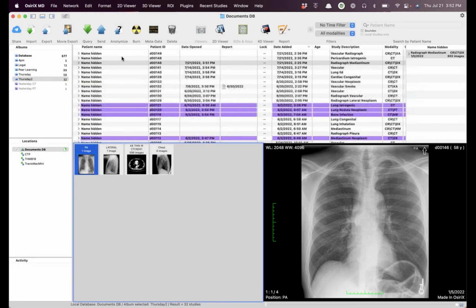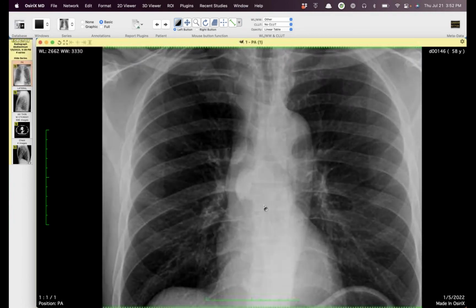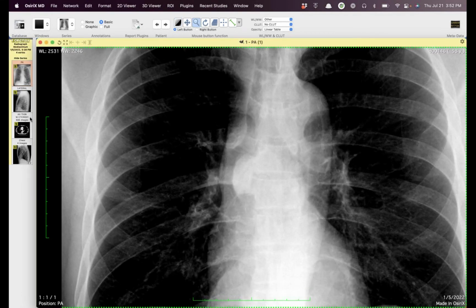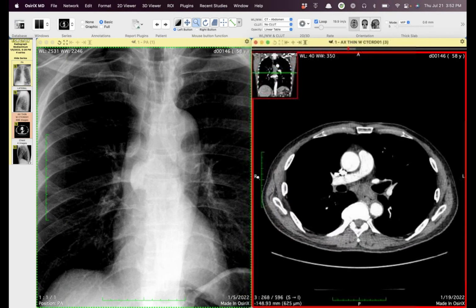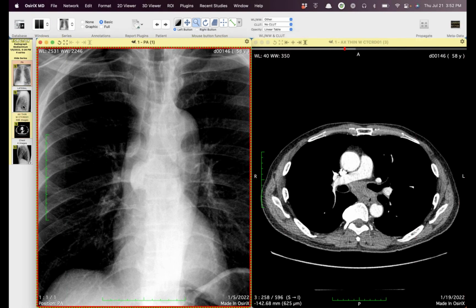I think one little hint of this thing on the frontal view is that the whiteness is not just the osteophyte, but it extends medially, overlying the vertebral bodies there too. So I think that's the subcarinal mass. Ooh, it's hard. Yeah, maybe. It's hard.